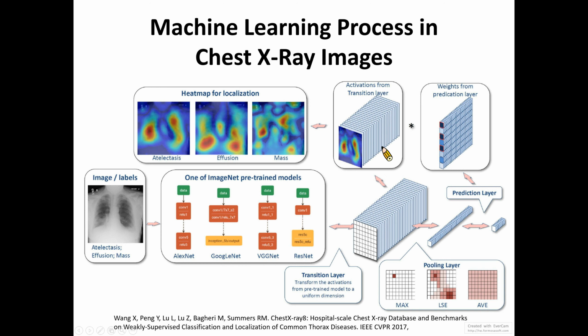Okay, so just close this window, and the next thing is to load the pre-trained network. I type net equals alexnet. When I do this, MATLAB returns an error message that alexnet requires the Deep Learning Toolbox Model for AlexNet Network support package. To install the support package, use the Add-On Explorer. So I click on this one. No worry if you see the same message.